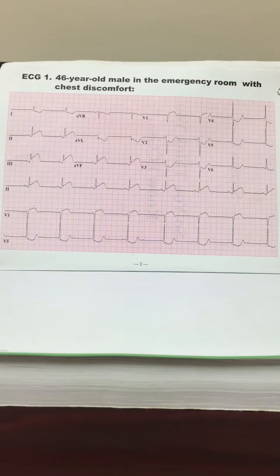I'm a third year medical student at Western University who's currently rotating with Dr. Benzor. And today I'm going to go through with you guys how to approach an EKG when you're first given one. One of the most important things to know when you're about to interpret an EKG is to do it methodically. Different doctors have different ways of approaching it, but I will go through with you today the most common way and the way Dr. Benzor likes to go through it.